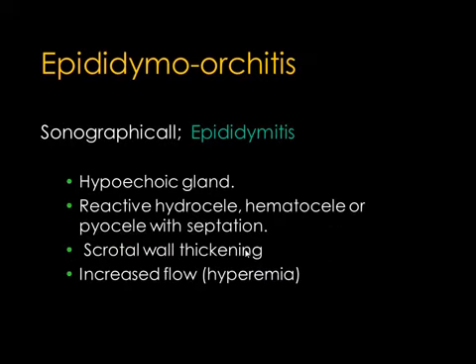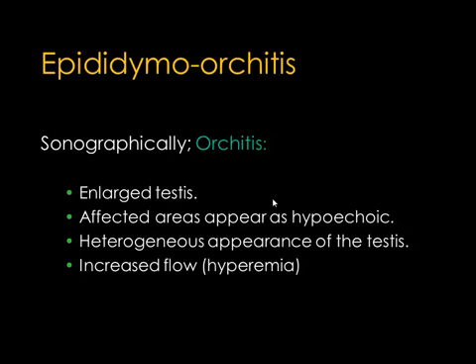Sonographically, the epididymis will appear as a hypoechoic gland. Sometimes there might be reactive hydrocele, hematocele, or pyocele with septations and scrotal wall thickening. On color Doppler, there is increased flow as a mark of hyperemia, which confirms the diagnosis.